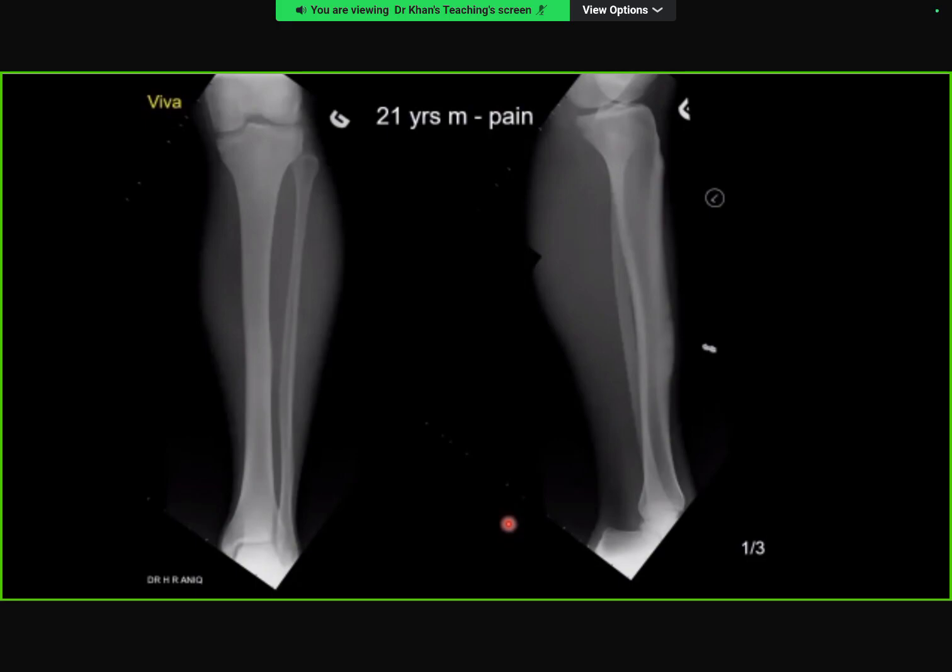It's more centered around the diaphysis. Okay, good. So you are talking about either an osteoid osteoma or an osteoblastoma. What else other than a tumor? Could it also be post-traumatic change? And which kind of trauma? Chronic trauma, repetitive trauma, as in a stress fracture.